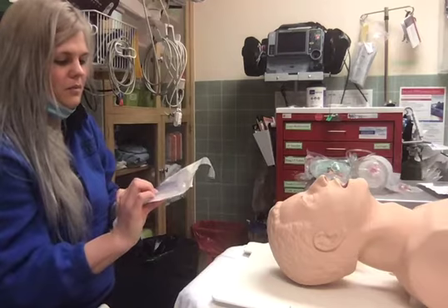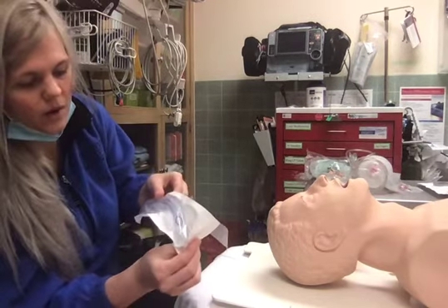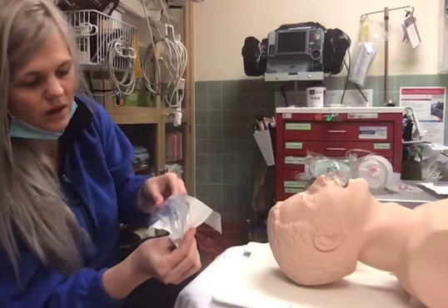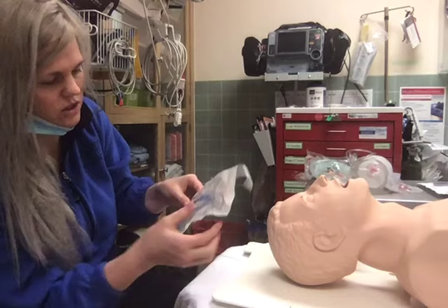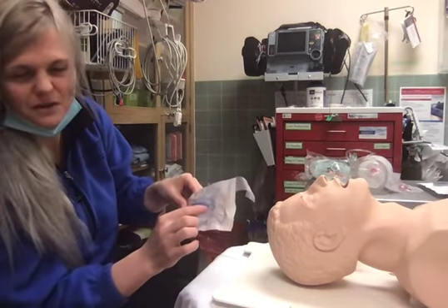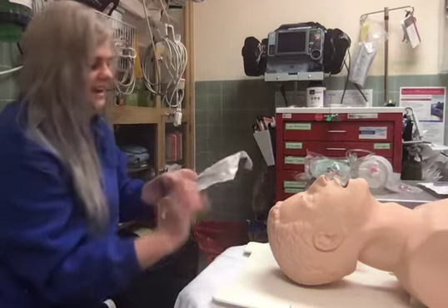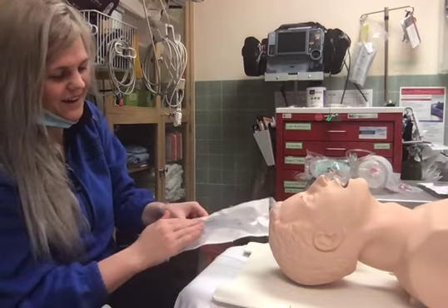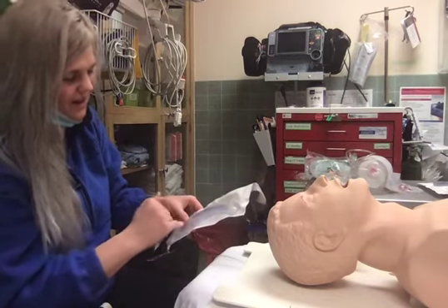As you may or may not be able to tell, that bevel there is for quite a large gauge of the passage. It doesn't feel good going in through the nose, I've been told. I've never, of course, had one done. But simply, you take lubrication, make sure to be nice to your patient, and get that very well lubricated.